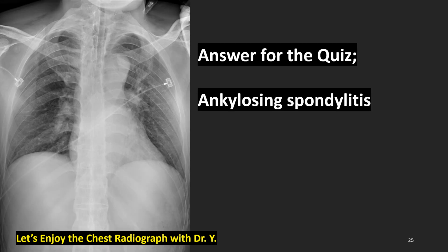This is the answer for the last quiz. Ankylosing spondylitis. Are you correct? It is also called bamboo spine. Congratulations!